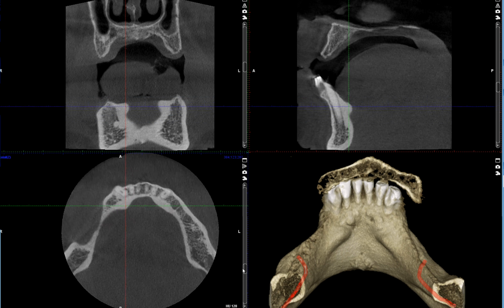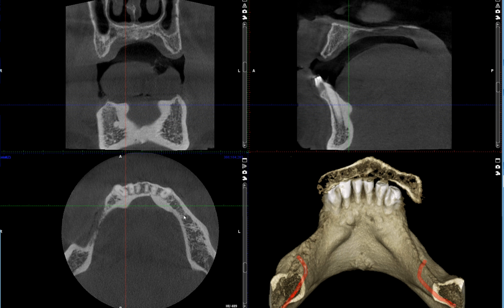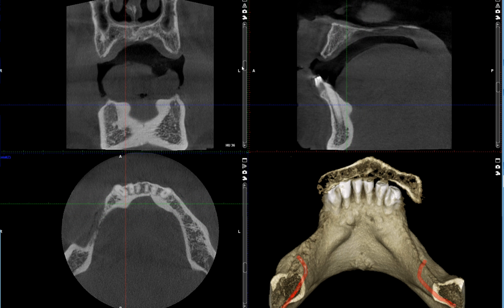Going through the axial planes, I hope you can recognize that there's a thickening of the cortical plate, or cortical bone density, lingual to these canines. Looking at the coronal section, you can see this exophytic extension or growth of the cortical bone bilaterally. And finally, if you look in the sagittal view, we can see that opacity once again.